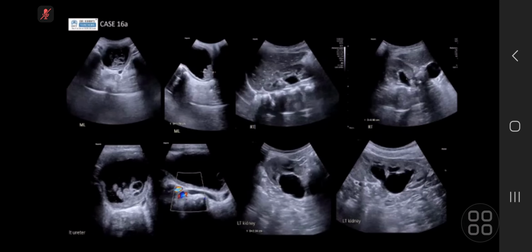My differential diagnosis here will be rhabdomyosarcoma of the urinary bladder, less likely clots or hematoma within the bladder to cause such bilateral hydroureteronephrosis, and less likely transitional cell cancer, which is more likely seen in adults. So I would like to inform the referring clinician and do a pediatric urology or cystoscopic evaluation and biopsy of the mass for further characterization. Do staging. Okay. So it's good.